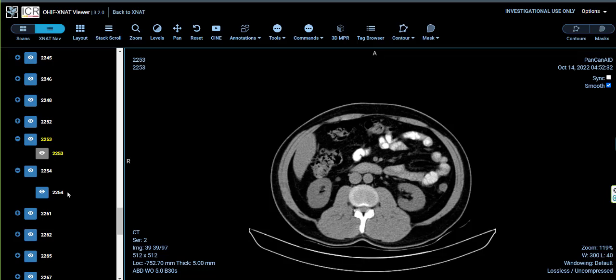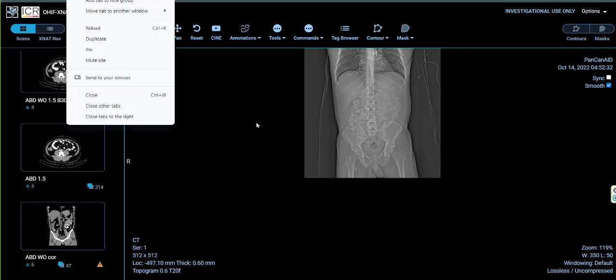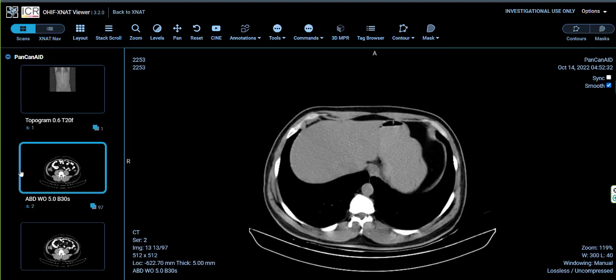Another important thing is to open these cases in your browser. You should usually have 3, 4, or 5 open windows. During your work, your browser can download some of these data into the cache, so it will be faster for you to open these cases.